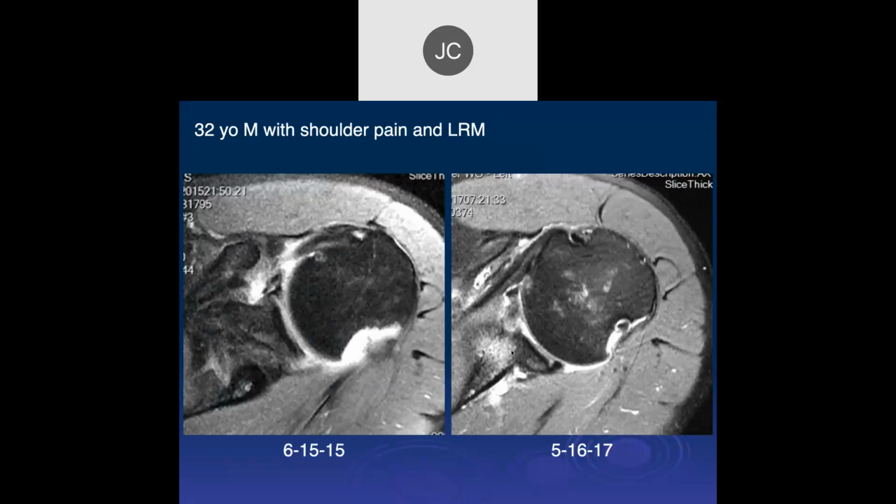And then this is 2 years before. So look at this, it's a big defect. And so right away, this is probably going to be an off-track lesion, right? Yeah. Okay, so this looks like a big off-track lesion.